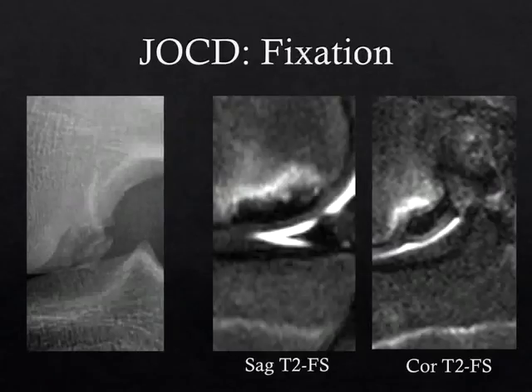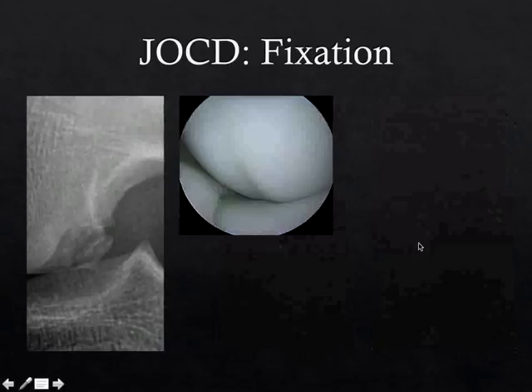Here's an unstable lesion in a kid. It was not diagnosed prospectively as unstable on MRI. You could question whether there are some breaks in the subchondral bone on this coronal T2 fat-sat image here. Obviously, there's some fragmentation, but sort of a borderline case. It ended up that it wasn't really unstable per se. It's what they call a trapdoor lesion, where the fragments are kind of ballooning out the articular cartilage. So if they probed this contour abnormality here, it would be soft. There's nothing for the articular cartilage to adhere to underneath, so that's a risk factor for developing instability.